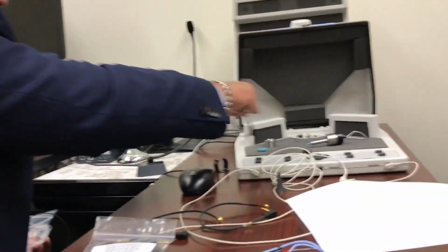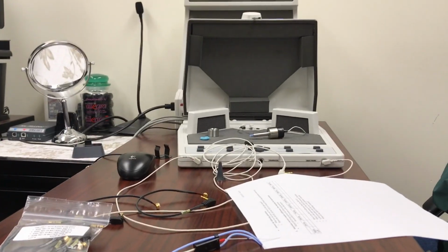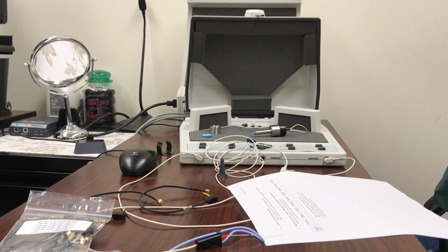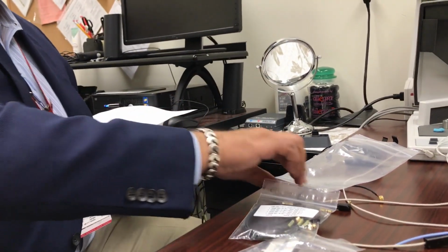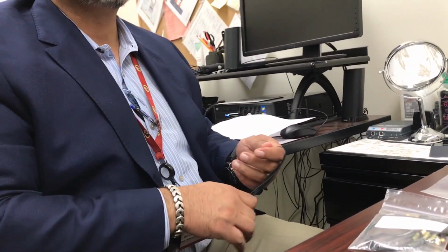The internal capabilities of a hearing aid, electroacoustically: take the battery out. So a patient comes in and says, my battery's intermittent, or my battery doesn't last a very long time. You put one of these into the battery pill, put it in the hearing aid, and run the device, and it will tell you whether or not the circuit of the hearing aid is working like it's supposed to. That allows you to do what we call a conformity test of the circuit, and that will tell you whether or not you need to send the hearing aid in. If it's working, then what's wrong? The patient has bad batteries.